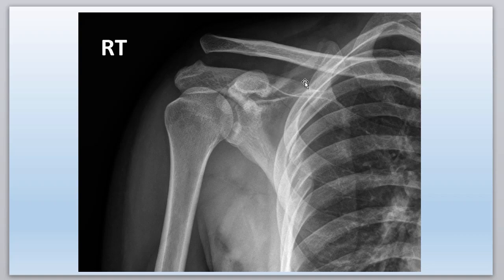Okay, we also have, looks like there's a fracture, not through the clavicle. See, the cortices are still intact. You can see those smoothly, but it looks like we have a fracture running right down through there. Okay, let's see, could be a fracture line here. Not 100% convinced. Sometimes big veins running through in the center of a bone can present like that.